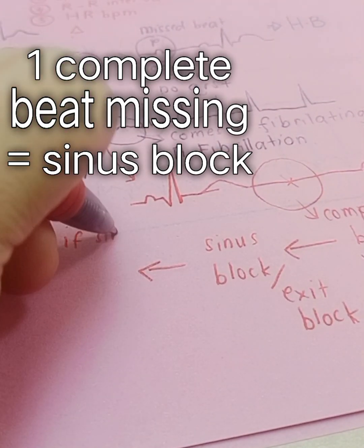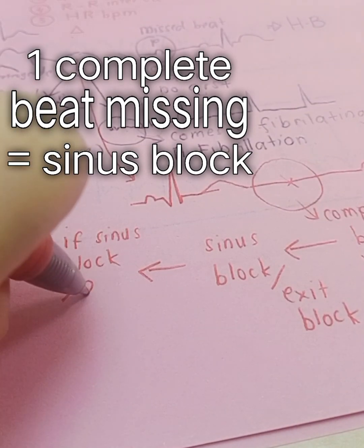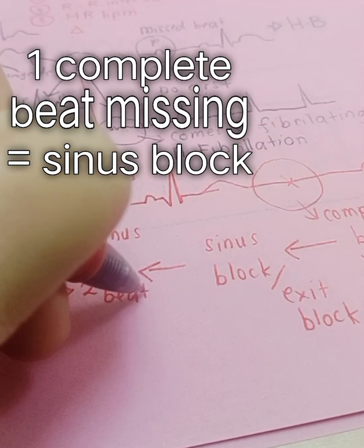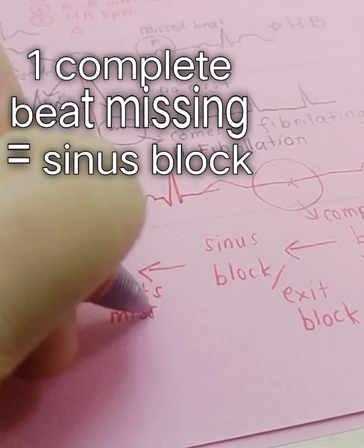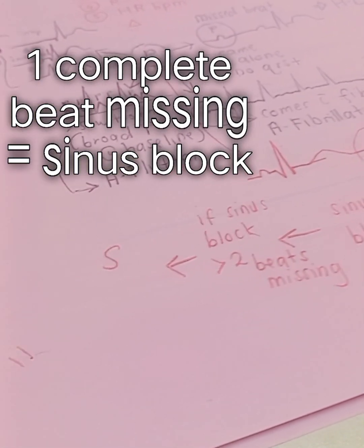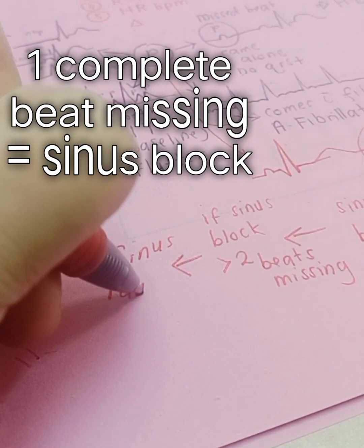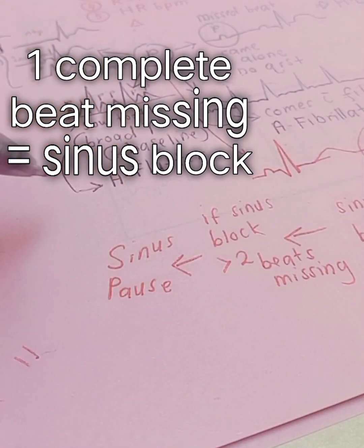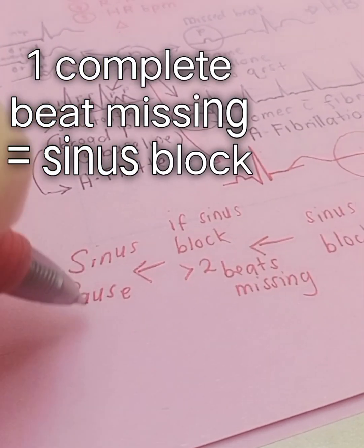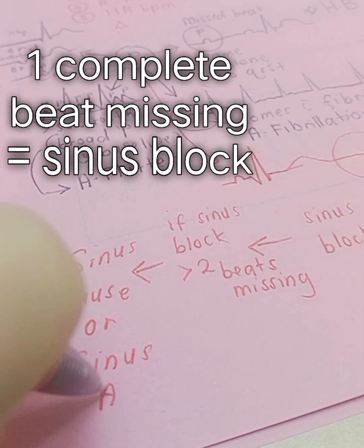If sinus block has more than 2 beats missing, it is sinus pause or sinus arrest.